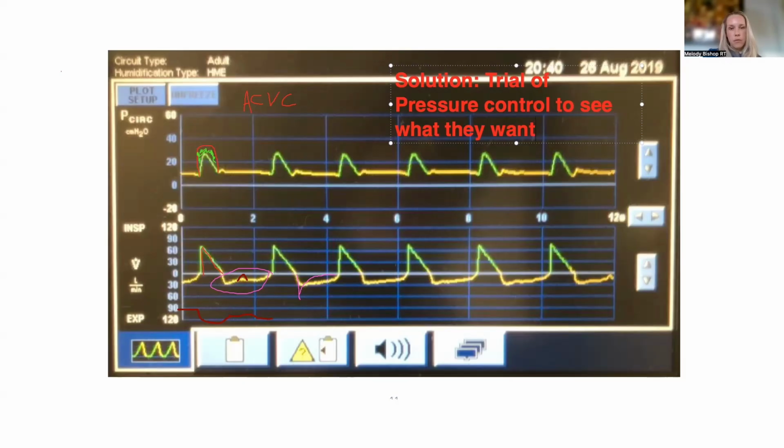And then what you are doing here is probably really causing diaphragmatic injury. You're certainly causing patient discomfort and all that kind of stuff. Maybe you might even cause some P-SILI as well, with that massive pressure loss inside the chest. Yes, 100%. I mean, you can't do a plateau, and this peak airway pressure is probably, I don't know, 23 at the most, right? Let's say 20, I don't know, whatever it is, 23, 24.